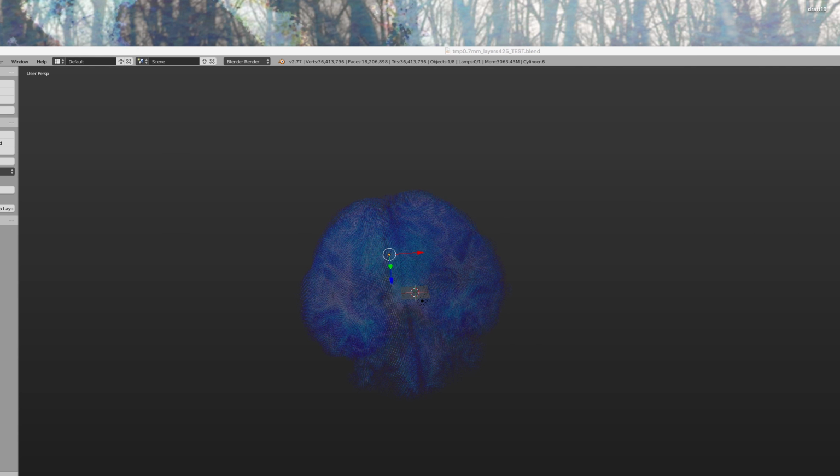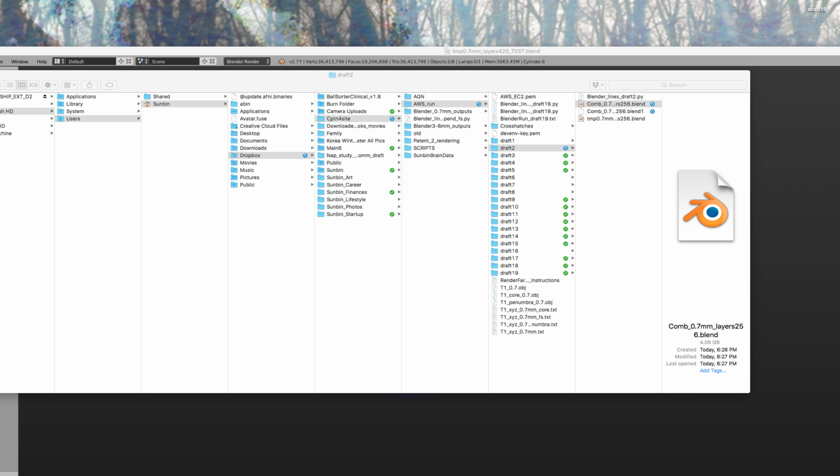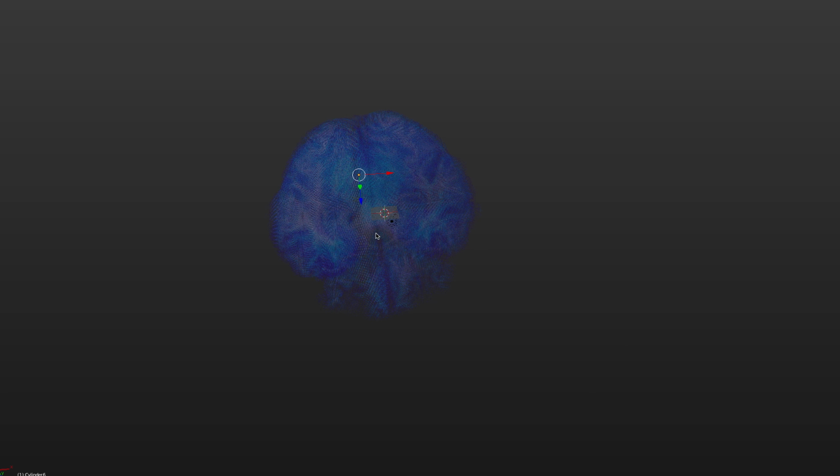So one other benefit to this, it can combine with slices and surface models, so it just gives an extra information. Hopefully it would be very, very useful for radiologists. I'm just going to pull up an older model to show you how that might be. This older model is not as good, as I made some changes, but it has some advantages as well. I'm making this video in a hurry, or else I would pull up one of the newer models that had the same features as this older model.